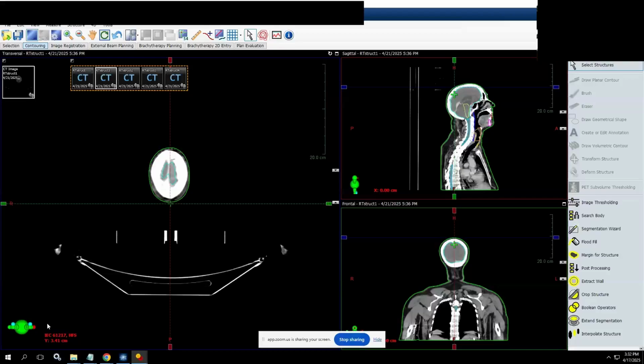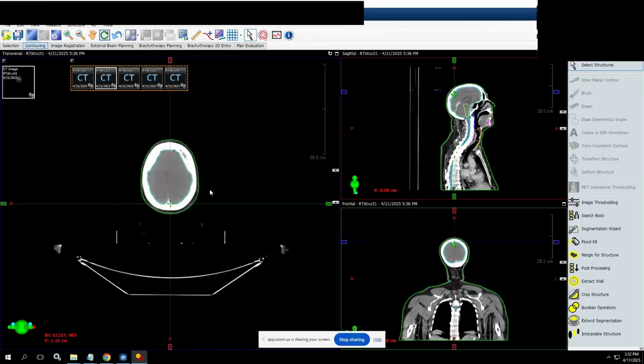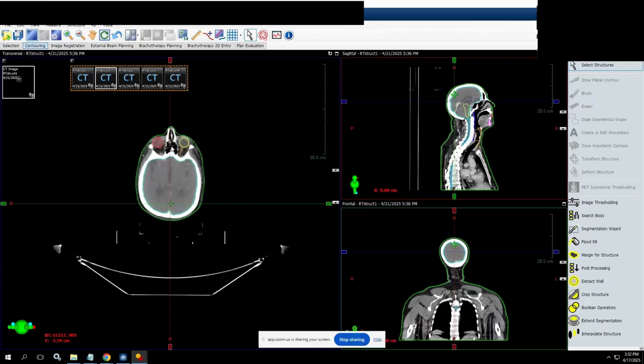In this demonstration, we will see how the nnU-Net models perform as far as the segmentation is concerned. We are giving a visual overview. As you can see, the model quantitative metrics are on our website. In addition, when you select a model, quantitative metrics like the Dice similarity index, the median Hausdorff distance, and the over-contouring and under-contouring distance metrics are also available.